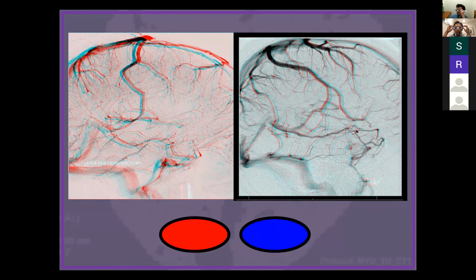Here you see one individual. Here's a dominant Rolando, and here's a dominant Trolard, here's a big basal vein. We'll get into the intricacies of stereo projections in a little bit, but I hope, for example, you can see that the image on the right is a little bit too deep. The superficial veins are coming out at you a lot, more than they should. That's one of the things we can vary.